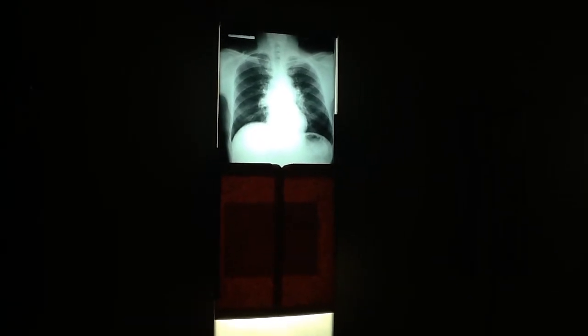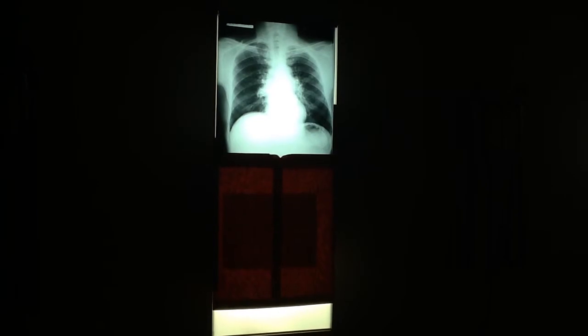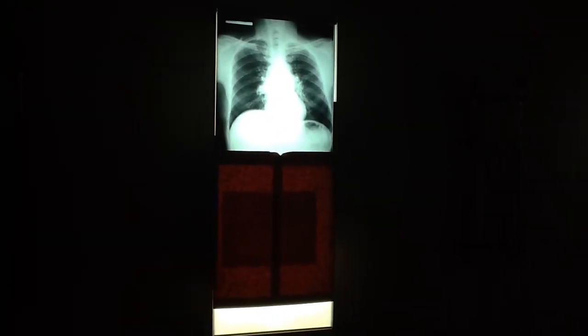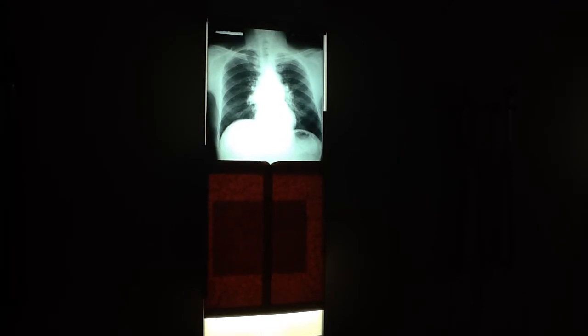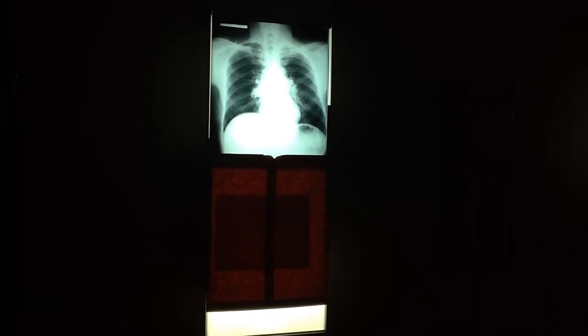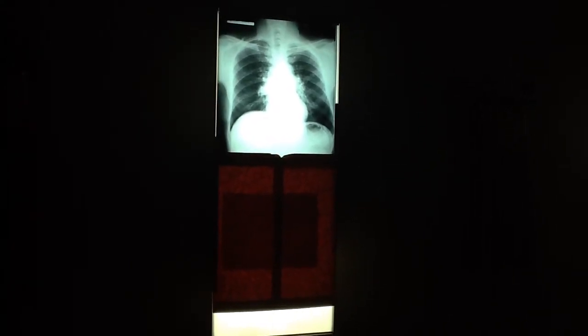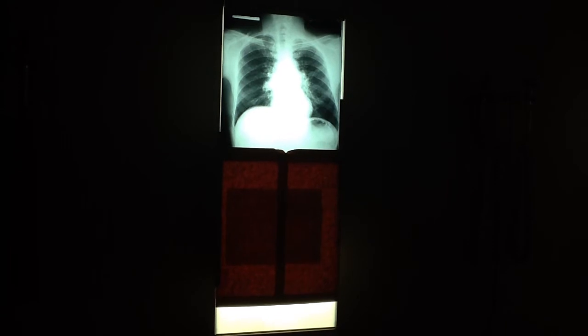And over decades of time, it actually could cause malignancies in those organs. So thorotrast hasn't been used for decades. A long time. It was really used back in the mid-1900s, last century. But that's what that is. And it's very bright, isn't it? Very bright looking. That's thorotrast.